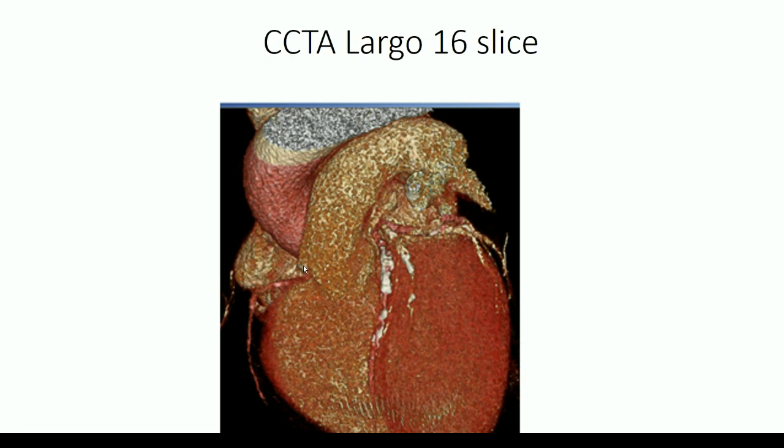The contrast was injected, but the scan started before the contrast got to the left ventricle, so this was a non-contrast study. This is the same thing as doing a calcium score, but doing a CT full dose with the injection of contrast, where the contrast bolus is behind the picture taking, and so it produces a study like this.